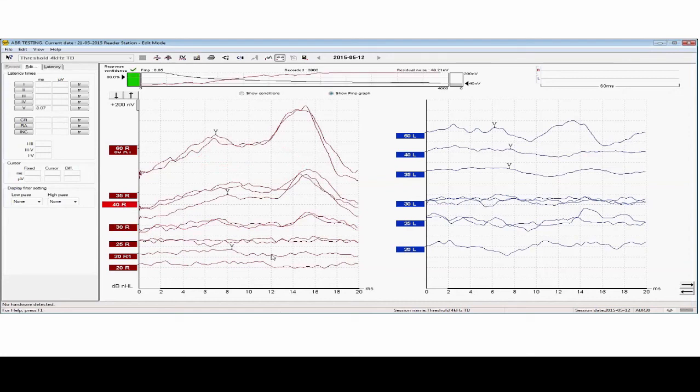There's a question concerning PAM again. Is it possible to get rid of it somehow? Yes, you can get rid of the PAM. The best way to get rid of it is to reposition your patient so that the neck tension disappears. It means removing or placing a pillow under the neck.